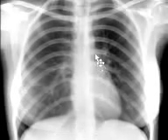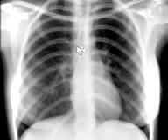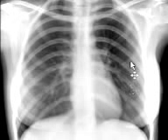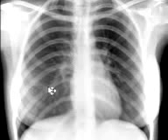So the trachea is central in this example, but gray scales are, however, not symmetrical over both lungs. Left lung looks a bit darker in upper zone as compared to right lung. However, in this particular patient, this does not represent any pathology because patient is slightly rotated towards the left side.